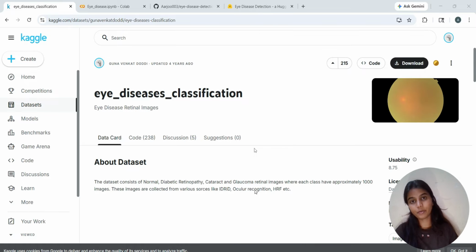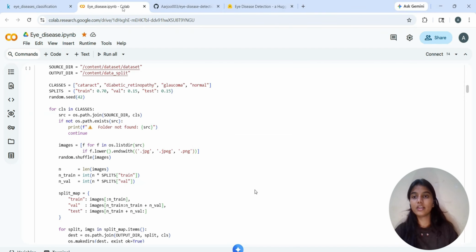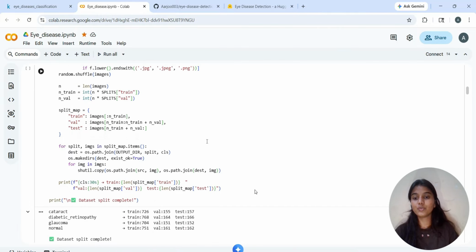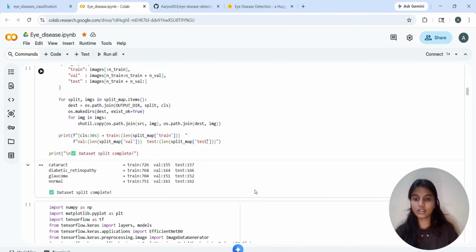Now we will move to the development part. I have performed the entire training process on Google Colab. Firstly, I cleaned my data through data preprocessing: I take all the images and resize them to exactly the same size so that the AI can easily understand the dataset. After that, I split my data into 3 categories: train, validation, and test.